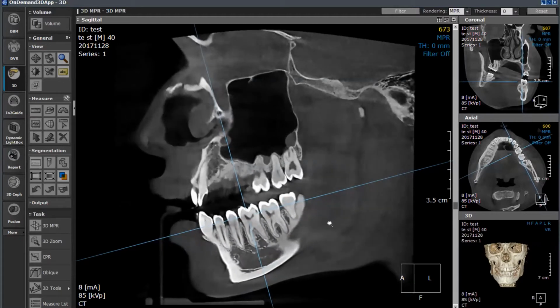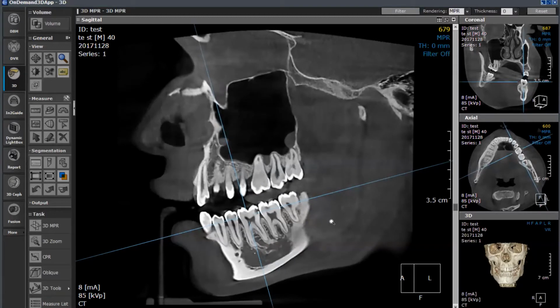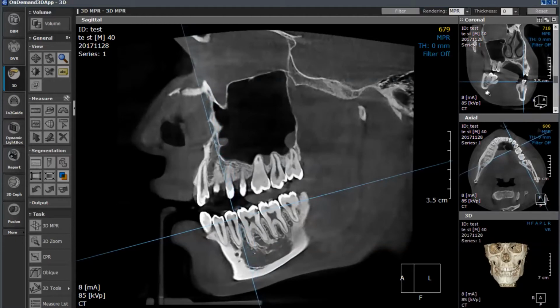Now, a number of you know who I am, and I came from orthopedics, and our rule was essentially one view means no views. So being able to take this and look at it from a different perspective, and be able to look at it from mesial distal. So you can see I'm moving my mouse up to the top and moving over because I want to be able to evaluate that first tooth there for if that's a cavity or not.